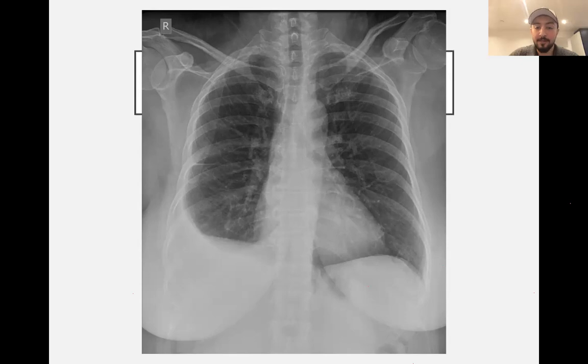You did a really good job. Really well done. You went through all the steps, and you identified the findings within this X-ray. And I really like the way you described this X-ray. You made sure you described things and did not assume or make comments. So you said that the lung markings are a bit prominent or a bit large, instead of saying, "Oh, this is, for example, maybe pleural effusion, or pulmonary edema." So you played it on the safe side, which is what you want. You want to describe things and not tell the doctor the diagnosis straight away. You can save the diagnosis for when you're presenting.